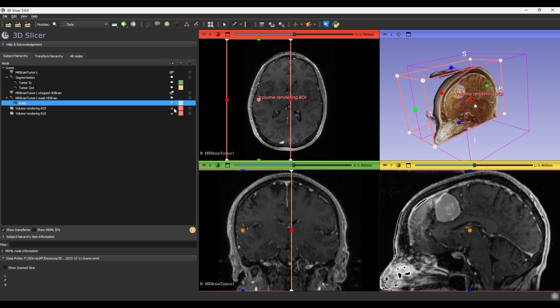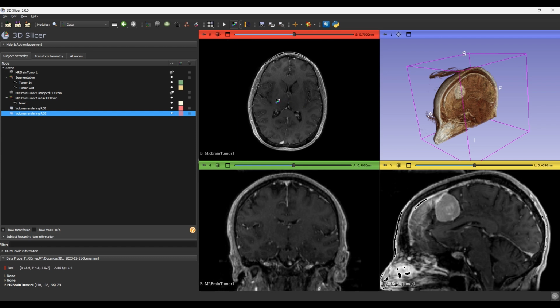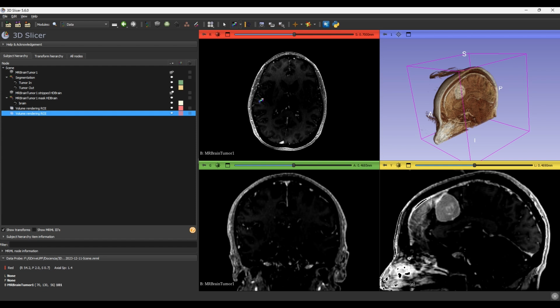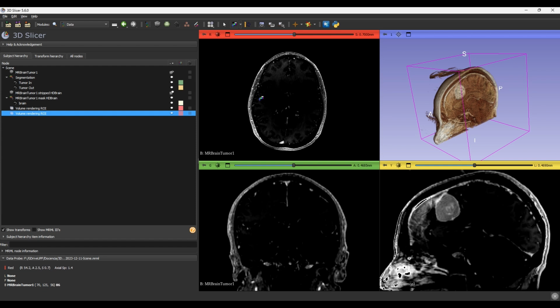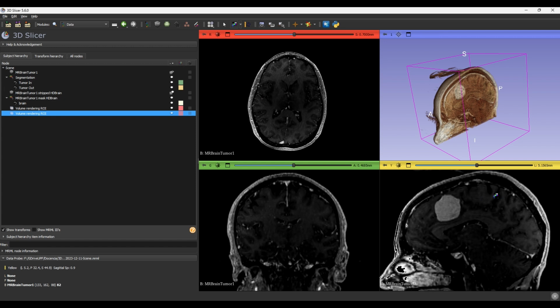In order to obtain a better visualization of the rigid tissues, use the Adjust Window Level tool placed on the top menu. Place the cursor over one of the 2D views. Hold the left button down and move up and down, left and right to change brightness and contrast of the image volumes. Fix the levels to clearly identify rigid tissues. Take care to not occlude parts of the rigid tissues. Remember that this is just affecting visualization and does not alter data. A correct visualization helps to obtain accurate results.